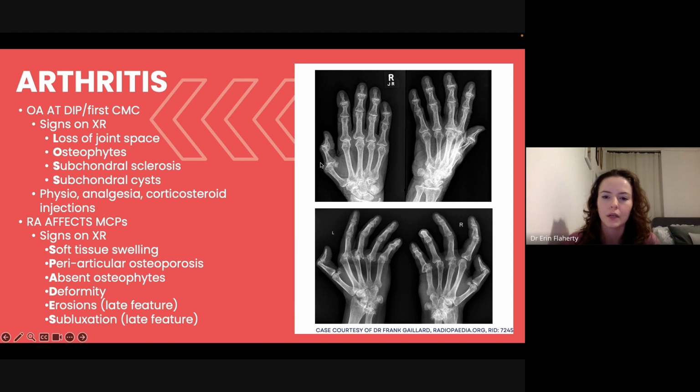Then if we look at some of the cartilage and the displacement, all these are pretty much aligned. This one looks a little bit dodgy, but that's probably because of the arthritis. And D, the density of these bones, you can see they're not very dense, and E, anything else.